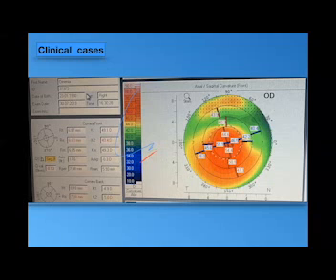Yes, Dr. Hossam is here. I am in the center of this cornea. The superior part of the cornea is 43.9. The next point is 40.3. The next point is 44.6. Crossing the center going to the inferior part, you will find the same point at the same circle is 54.4, right? The next is 50.